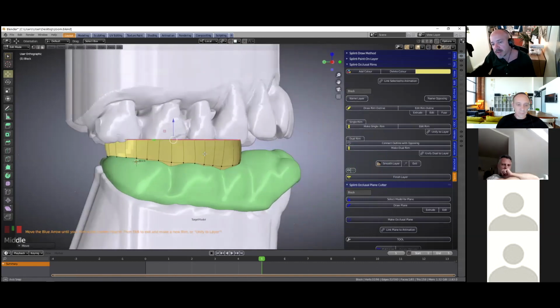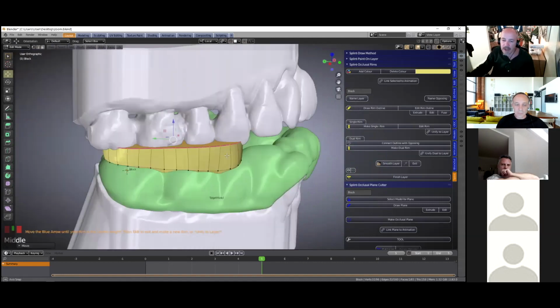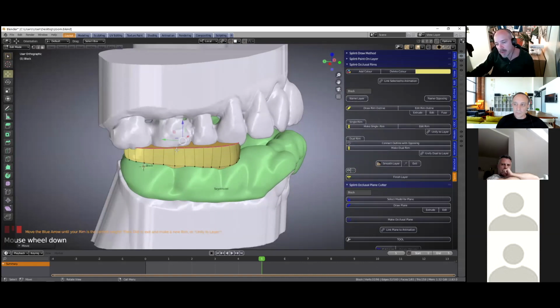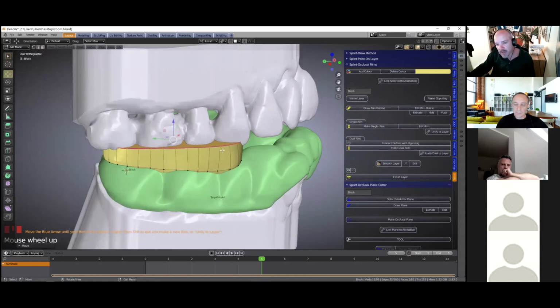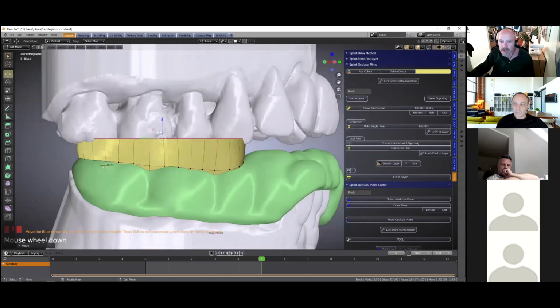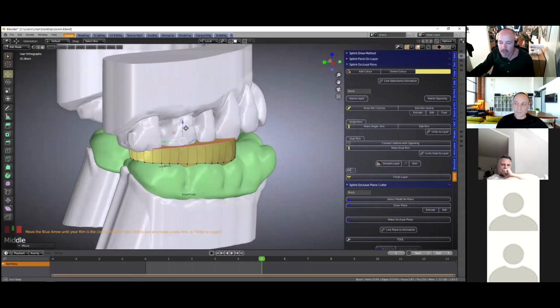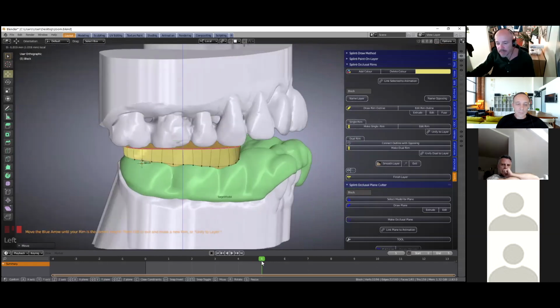And for those of you that have the splint, I've made a few updates today. Just click update module. For example, this one has a subdivision surface modifier, so it looks a little bit different to what we had beforehand.